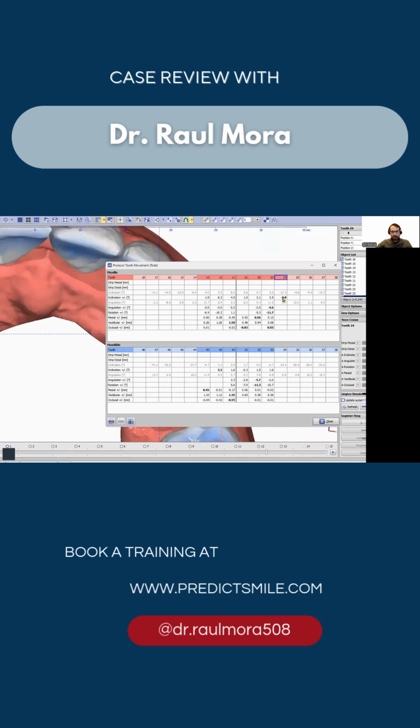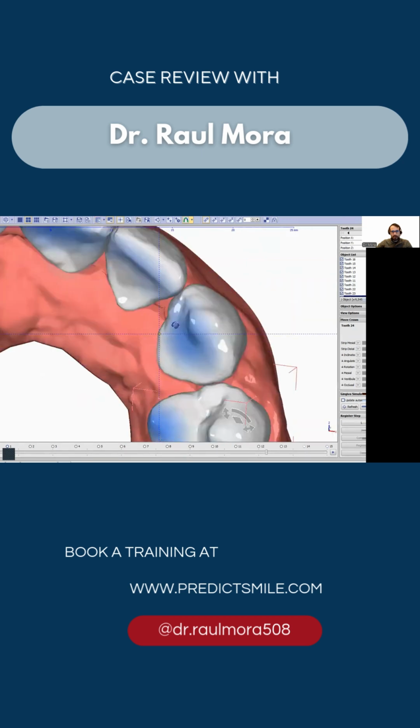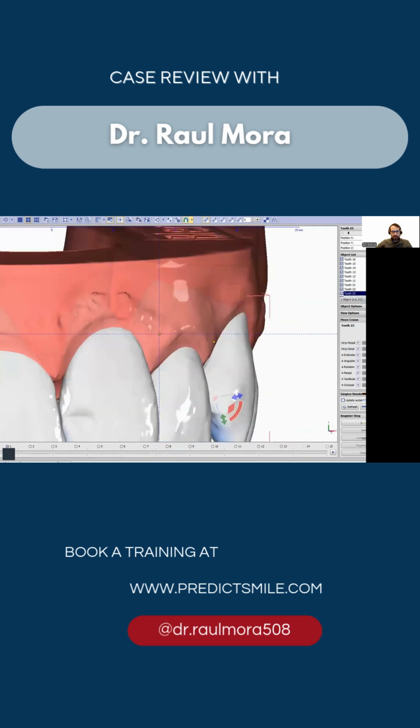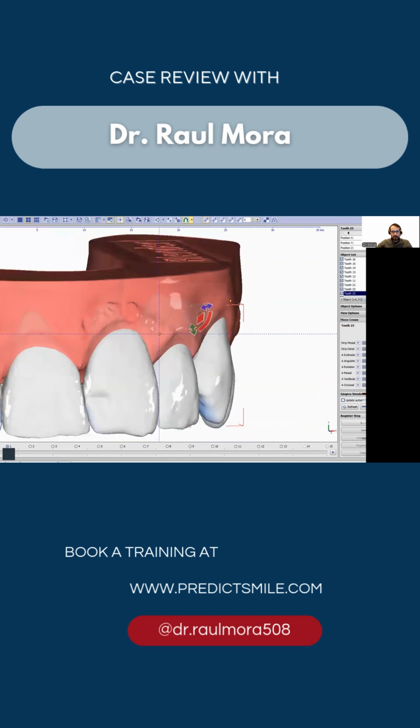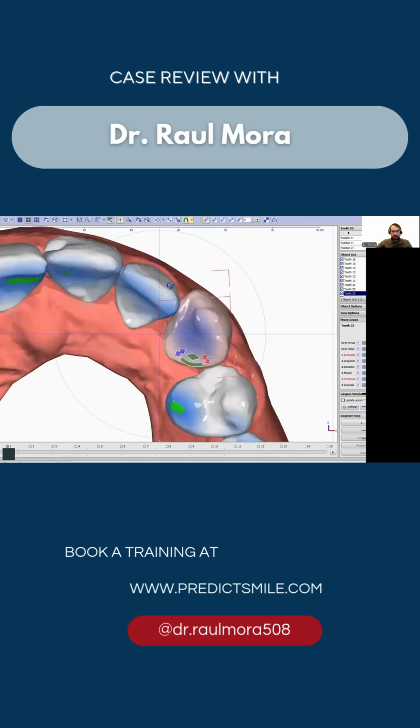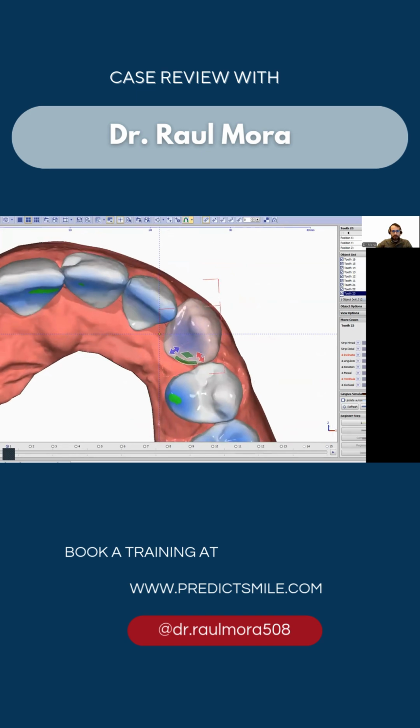This canine has 9 degrees, sorry, 11 degrees of rotation and some pro inclination. So let's give all of the proclination to the canine, the 3 degrees and something that we had. And we're going to give the rotation at the same time. 11 degrees. Let me just double check where the rotation is.